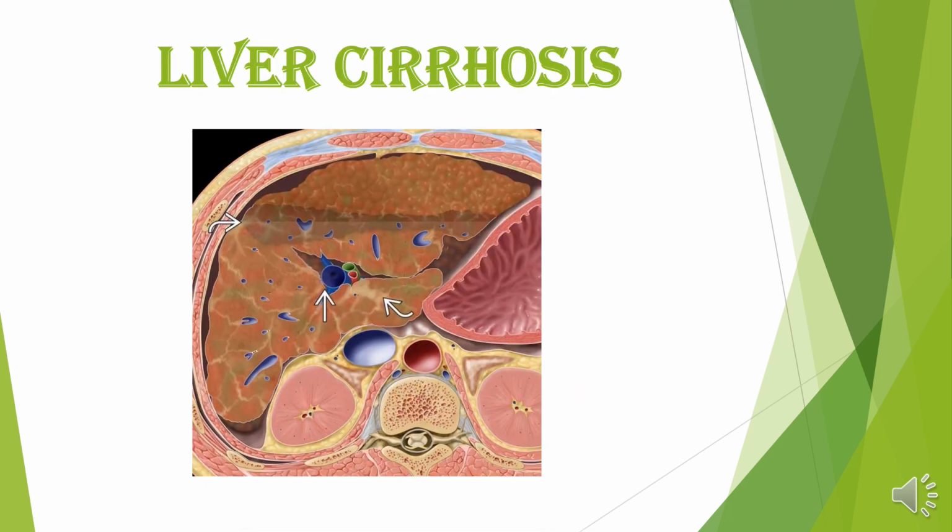Liver cirrhosis is the hepatic cause of portal hypertension. As you see here, this is the normal liver parenchyma and this is the cirrhotic liver. These regenerating nodules are compressing the portal channels, and the back pressure change will be seen in this main portal vein as portal hypertension.